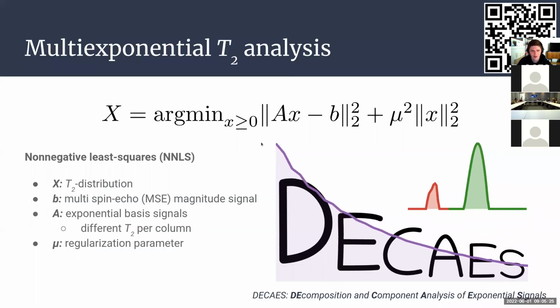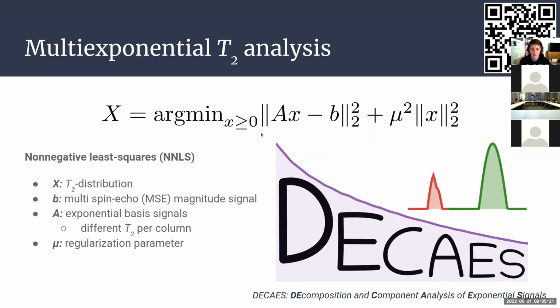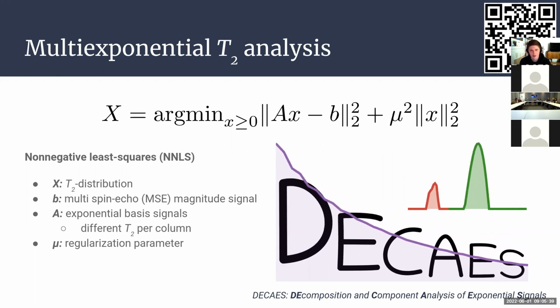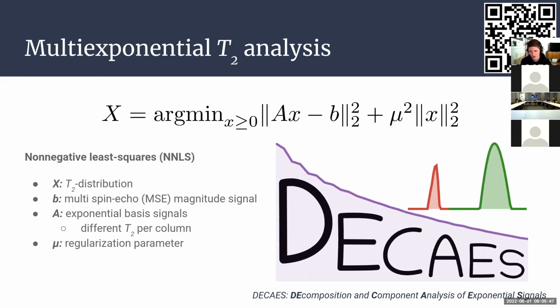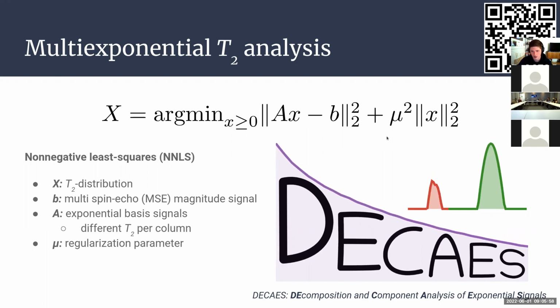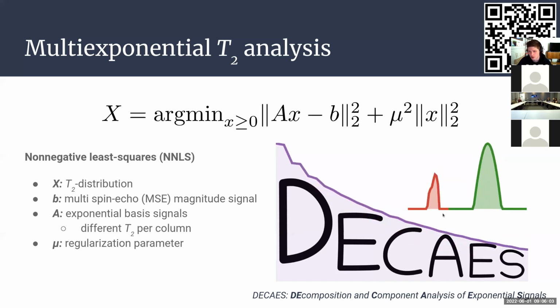So let's get started. This is a one-slide overview of what this software does. I'm sure many people here will be familiar with this, of course, but this is Myelin water imaging and Luminal water imaging. The backbone of it is multi-exponential T2 analysis. Much like the bi or tri-exponential fitting you've probably seen in your undergrad lab courses, this is multi-exponential. We essentially want to take a measured exponential looking signal, like this purple signal being animated here on this decays logo, and break it down into its constituent exponential components.